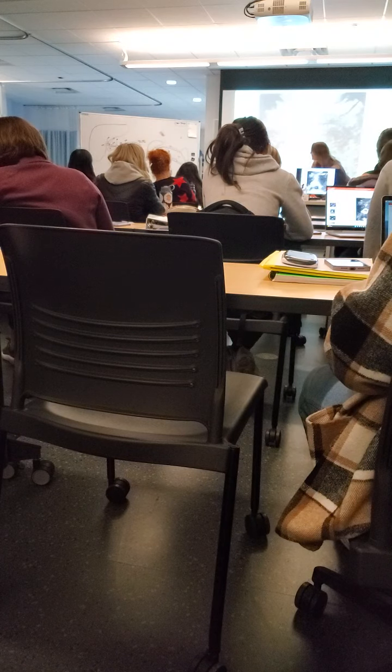Okay, so here, this is not the best image, but you can see here's our dilated duct again. Why do they appear to have an echogenic wall? Physics, physics, physics. Is there a flat tor beam? Okay, all right, you win. They're flat to the beam, so they have a lot of specular reflections. They're reflecting a lot of our beam back. It's not that they're echogenic, we're just getting a lot of beam return.